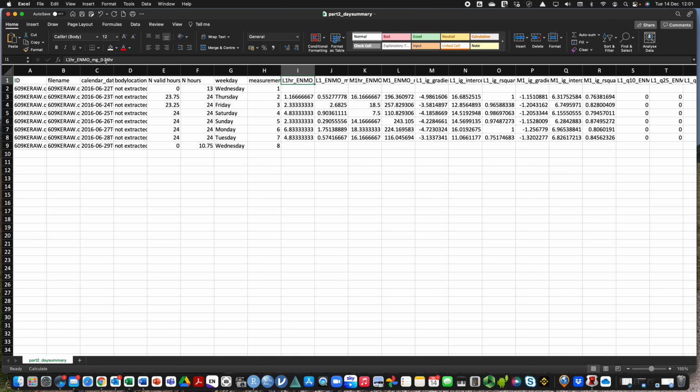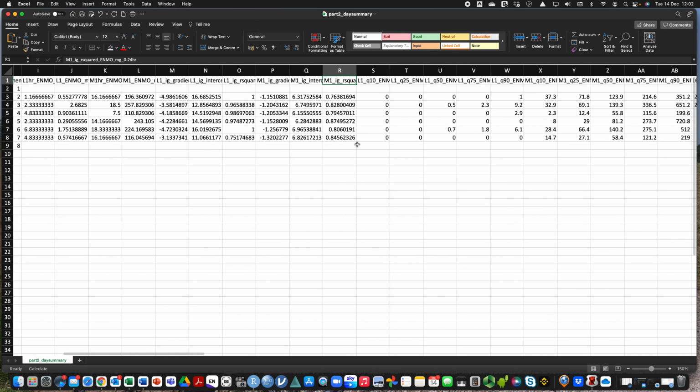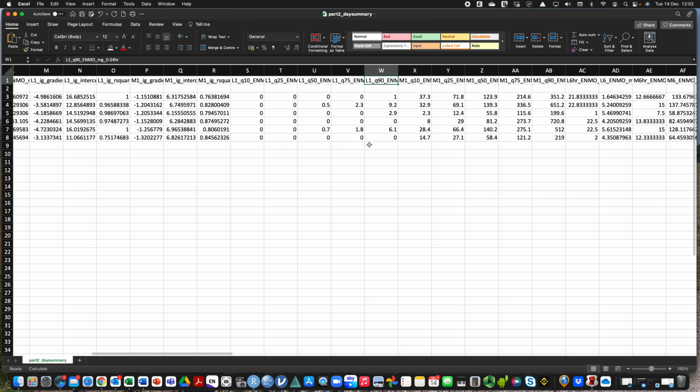So where it's got 0 to 24 hours, this represents the recording windows which we specified. And typically, if we wanted 0 to 24 hours, these are the variables or the output that we would actually use. And now I just flagged that up because as we go along, we might find some slightly different output.